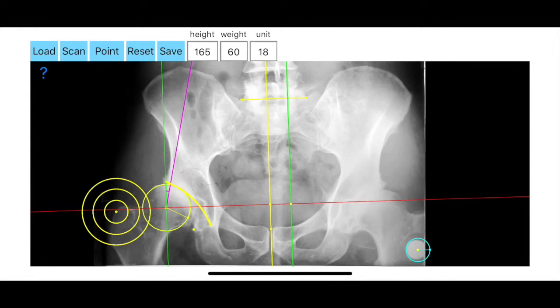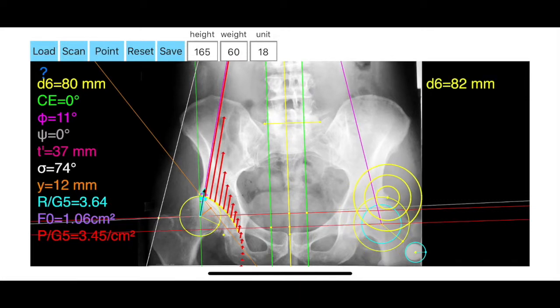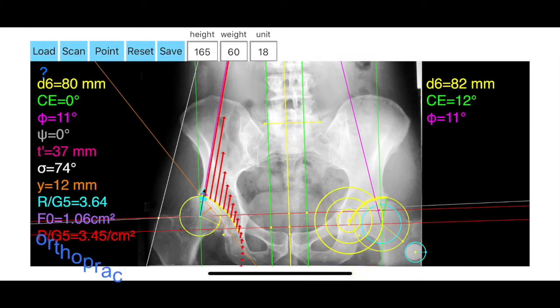of the left femoral head C13, R14, and as mentioned above, with the same order you mark the rest of the points at the left side as follows. E15, lateral acetabular margin of the acetabulum. A16, deepest point of the roof of the acetabulum or the triradiate cartilage. V17, acetabular teardrop. D18, intersection of the femoral head at the postero-inferior acetabular margin. T19, insertion of the hip abductors on the greater trochanter.